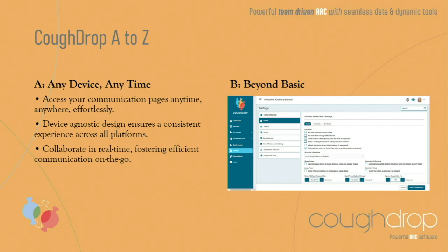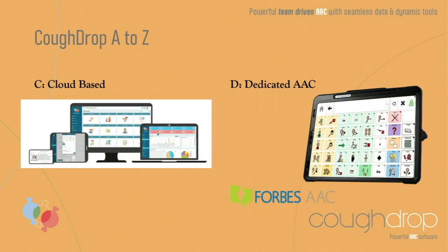So for basic, CoughDrop is loaded with so many features, and I will admit, as a clinician, I had no idea, and I wish that I had CoughDrop in my life. Within CoughDrop, you have a lot of integrated tools and things that we'll get to, but it's so much more than just an AAC app. So just want you guys to start thinking about all the things that are contained within CoughDrop.